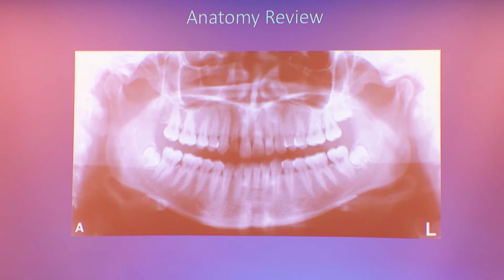And I think the rest of the anatomy we've pretty much covered. Just let me say some quick things. Here's the epiglottis. It's hard to use the pointer here, but there's an image here and then an image there. Two lines of contrast, just separated a little bit. They both represent the posterior pharyngeal wall. The patient was breathing, so that soft tissue was in different positions during the exposure, and that's why we have two images of it. You'll often see two images of the dorsum of the tongue as well, if the tongue was moving.